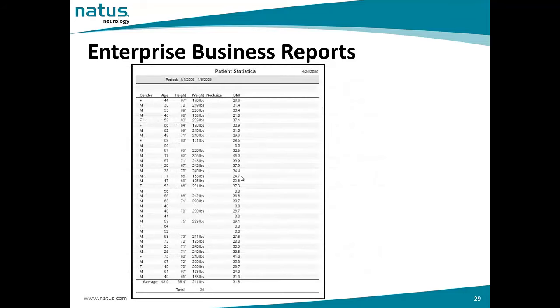I can also generate a patient statistics report whereby it can show you a period of time, for example, from January to August. What will be the statistics of the patients that we have for the sleep lab?